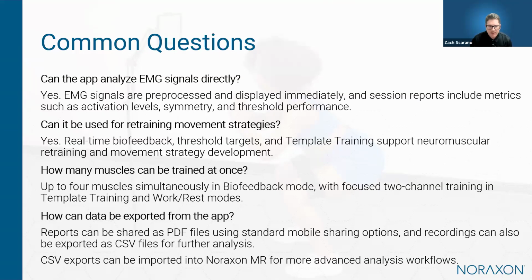And finally, there was a question about exporting data. Reports can be shared as PDF files using the standard mobile sharing options. This makes it very easy to send results or add them to clinical records. And recordings can also be exported as CSV files, which can be imported into the MR software if more advanced analysis workflows are needed.